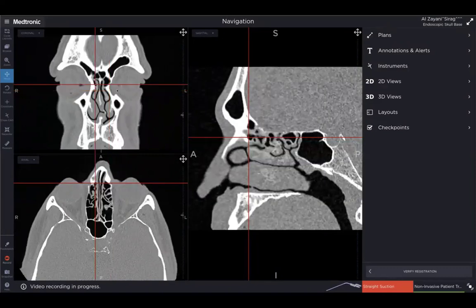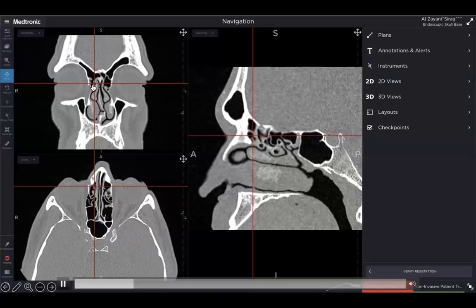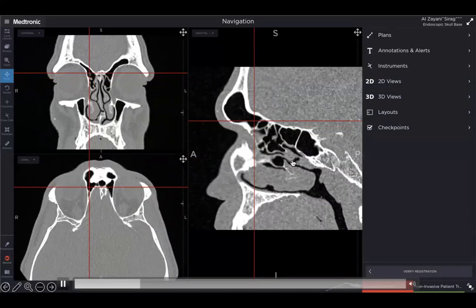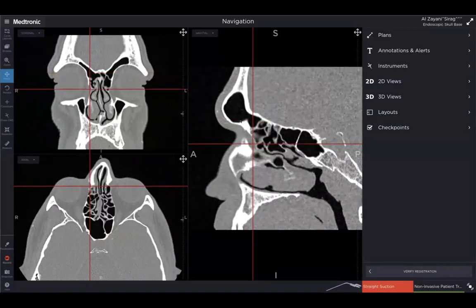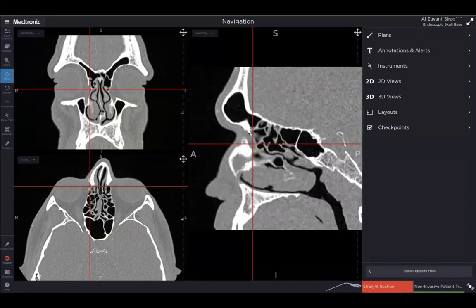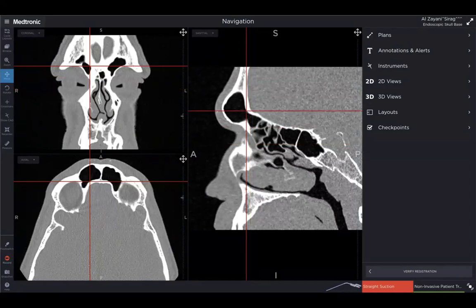But remember, we had that question about an intersinus septal cell. So this is now looking at the right side, and I'm pinpointing the agger nasi on the right side. And you can see the agger nasi on the sagittal quite nicely, and the cell immediately above it is actually the frontal sinus. So this patient does not have any cells above the agger nasi cell on the right side, right? So that's good. That tells me that once I'm at the skull base and I'm past the basal lamella, I will get into the frontal sinus, and there won't be any cells for me to contend with in the frontal sinus. That's on the right side, right?